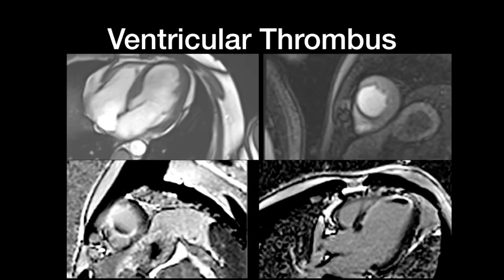Another common condition where we see intraventricular thrombus is along the infarcted myocardium, which shows hypo or akinesia, where late gadolinium enhancement will show enhancement in the infarcted myocardium with a lamellar thrombus which is not at all enhancing along the adjacent ventricular cavity. These thrombi are best seen on the LGE images and can be missed on SSFP images.